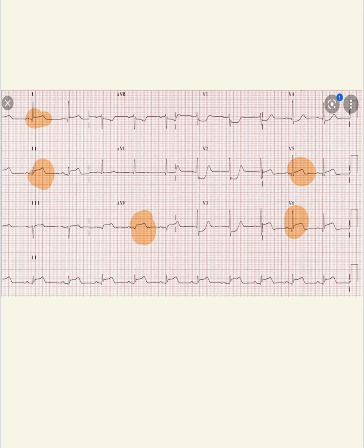This is rarely infarction just in the lateral wall. There is ST segment elevation in the lead 1, and V5, V6. This is lateral wall infarction. Okay, هسه جاي احكي just about the lateral wall. There is also inferior wall, هذا مو موضوعنا. عندنا lateral wall infarction.